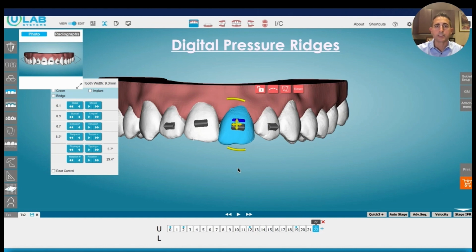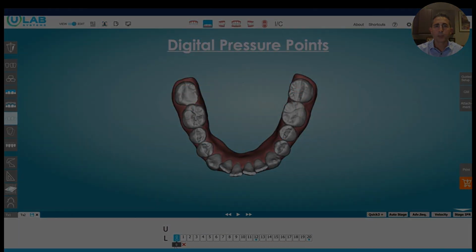All I'm going to do is apply the forces that are necessary to move the teeth and make those forces via a chairside refinement. Order these aligners. The patient will wear these aligners. They'll come back, in this case 6 weeks, and we would go ahead and look at their teeth again and continue that process.